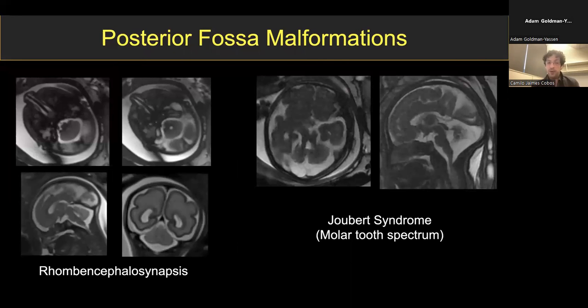I wanted to show you that there are also more malformations and abnormalities than just inferior vermian hypoplasia. We see occasionally a couple of cases a year of rhombencephalosynapsis, so I wanted to show it. First clue, the cerebellum is tiny. So if you do biometry by MR or by ultrasound, it's really small. Second, it looks like a ball. There is just a completely convex architecture to the cerebellum. I can't say that I can see the stripes go through and through, but what I'll tell you is this rounded appearance is very characteristic of rhombencephalosynapsis.